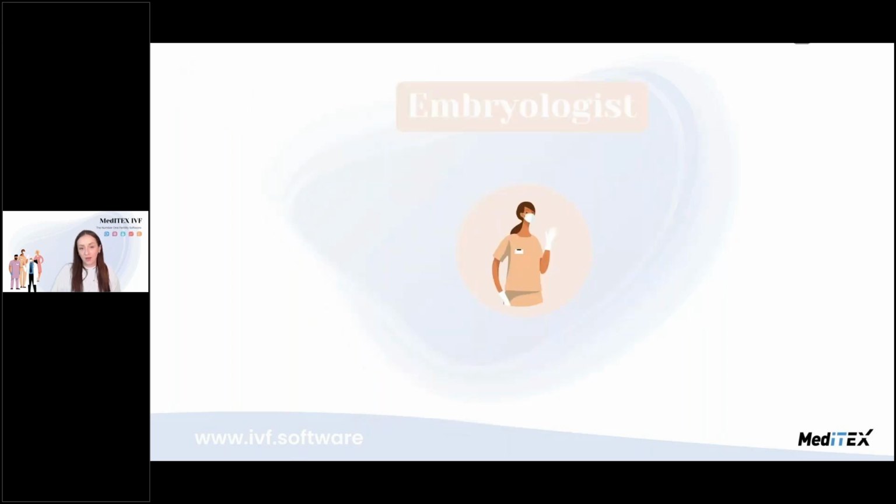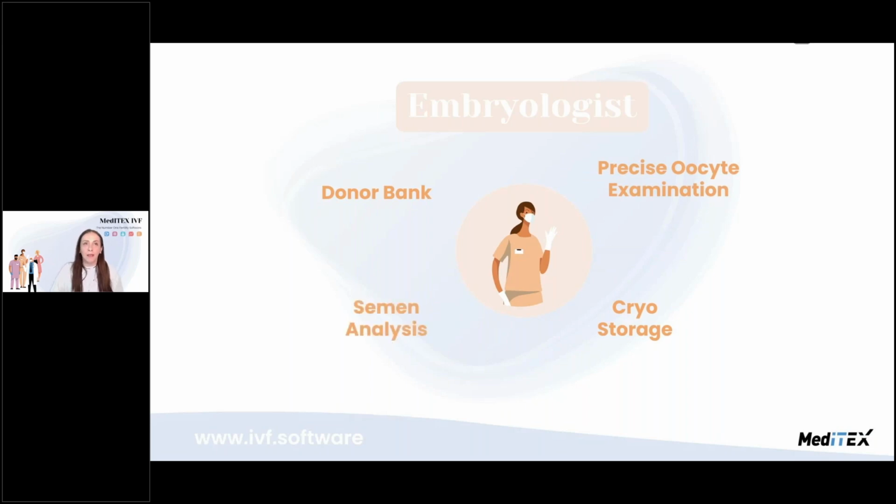Great. Now I would like to talk a little bit about the embryologist in MedITEX IVF. The embryologist has different sections within MedITEX IVF. We have a donor bank. There's also a cryostorage. The precise oocyte examination is also a big part of MedITEX IVF, and the semen analysis. Now here, I would also like to mention again that this is not fixed. This is just experience-based. And if in your clinic you feel like you have different tasks for your staff members, there's no problem at all. This is just from the experience.